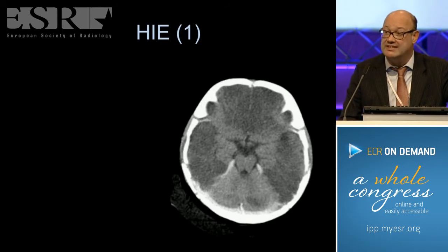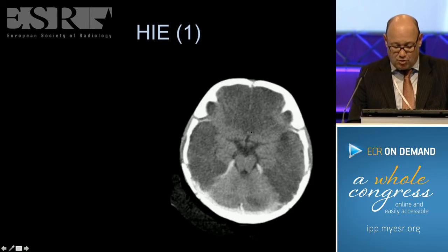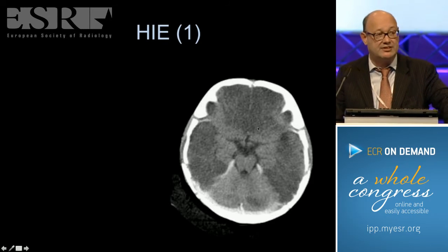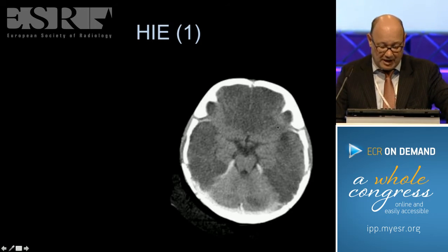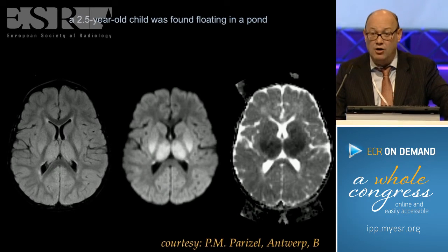Also, hypoxic ischemic encephalopathy may give abnormalities, but they will show larger abnormalities, symmetrical. If you see symmetrical abnormalities, you should think about toxic and metabolic abnormalities. You see hypodense aspect of the brain parenchyma, white cerebellum. This is typically what you will encounter in patients with hypoxic ischemic encephalopathy. Very vulnerable structures in the brain are the deep gray nuclei.